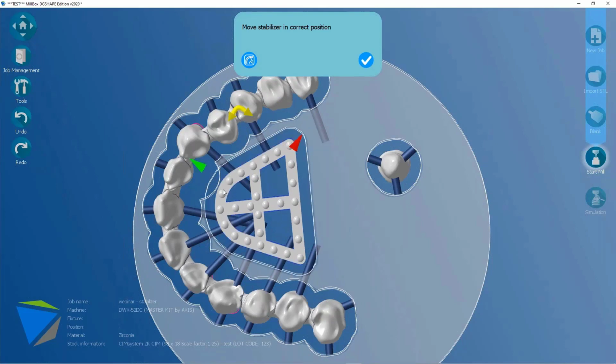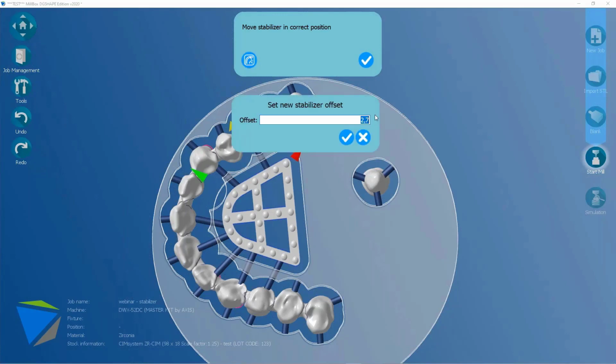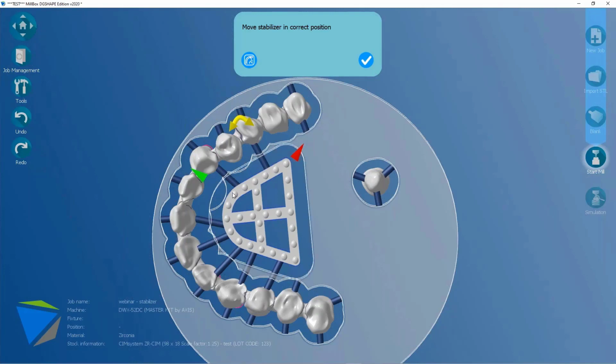Okay, of course, this is maybe too small for this case, but having a big library of this kind of shapes, I can choose the one that I need, the one that's much more comfortable. This one is too small, of course, for example. And here I can manage, for example, a different kind of offset to enlarge the area, in order to remove this external material.